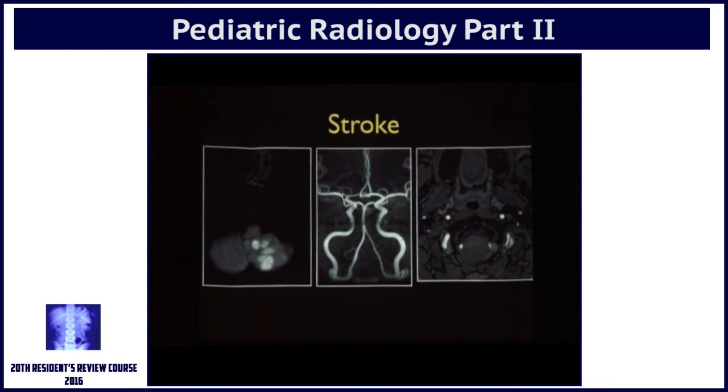Okay, so now this is a young child, a 15-year-old child who suddenly came with vertigo and imbalance after doing a performance in school of break dance, and then he fell and then he had this. So diagnosis, excellent. So which vertebral artery, which segment rather, can we see it over here? So we can actually, this was a stroke here.